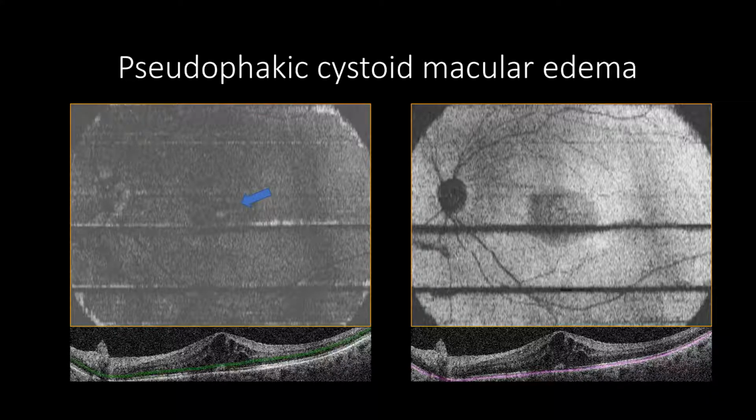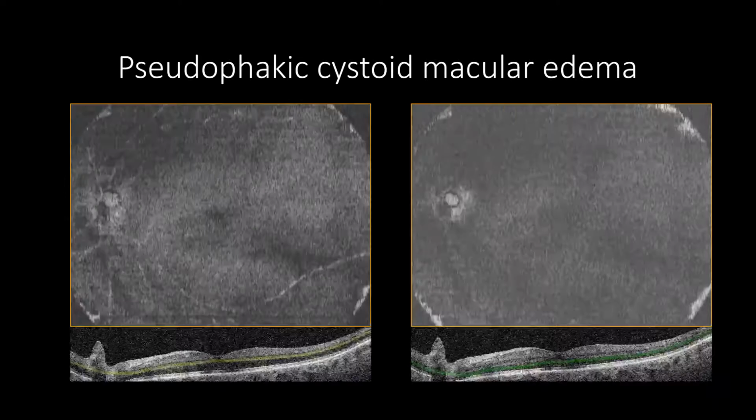The subretinal fluids may show an inner hyperreflective circle with hyporeflective content depending on the subretinal fluid's size and thickness of photoreceptor layer. Please note the blink artifact. The RPE slab will show projection artifacts in severe cases.